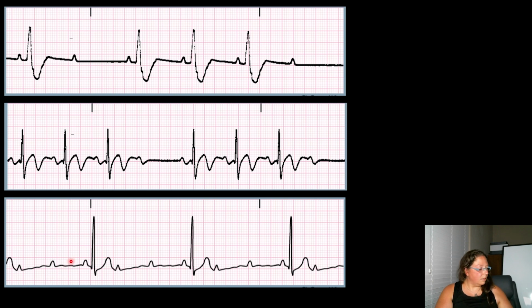Now look at this one. This one is also a super low heart rate. Here it is 30. Look at all these P waves. See all these P waves? Only 1 out of 3 are getting through here. Look.